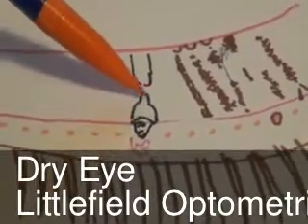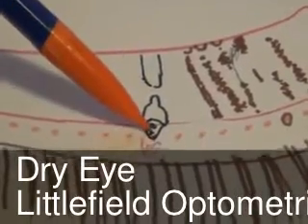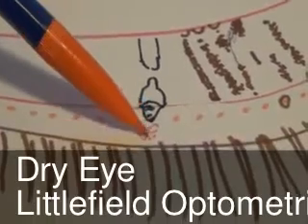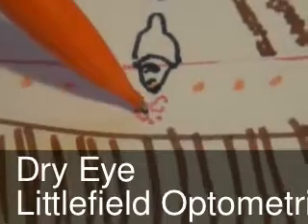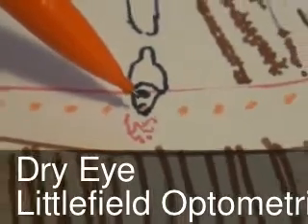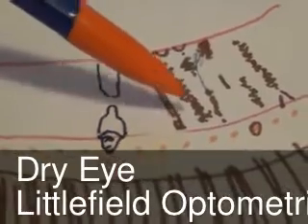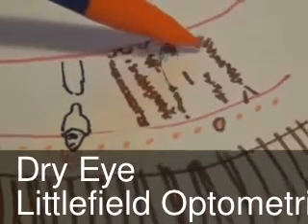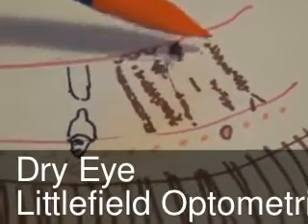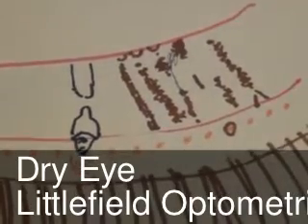Inflamed or blocked orifices set up enlarged or uneven glands near the orifice. Orifice inflammations always give associated telangiectasia of the nearby lid margins. Deeper inflammations are always localized and cause acini death and damage, leaving an uneven thickness to the gland and duct. Gland width irregularity is due to focal acini being blocked and degenerating.